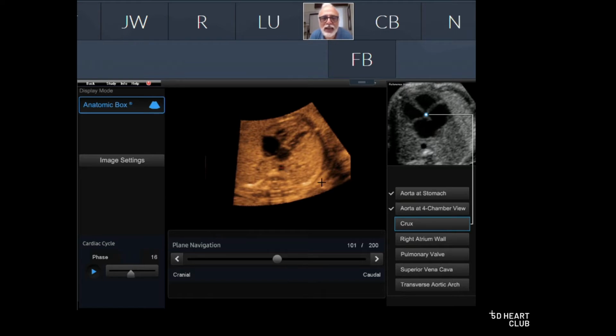It was okay, but it was a little bit rightish. See? Okay. So please click on the aorta at the 4-chamber view again button. Yes. And mark it in the center of the circle. Good. This marking is critical. Okay, see now the cursor went up.